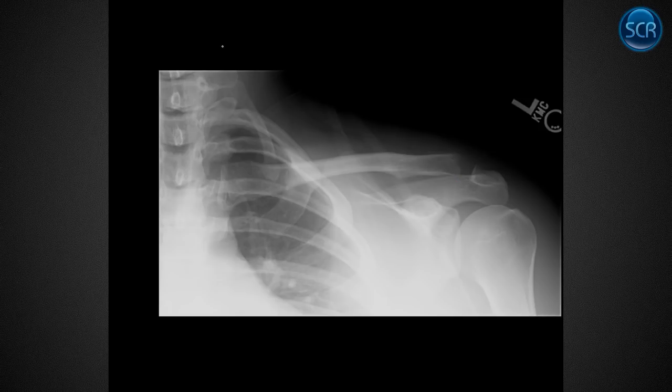Looking at the film more comprehensively, also note that they have a cervical rib over here. That could pop up. You could expect some thoracic outlet syndrome. This would be a good case for boards because we've got 2 findings here, so it would be very easy to write a question on this case.